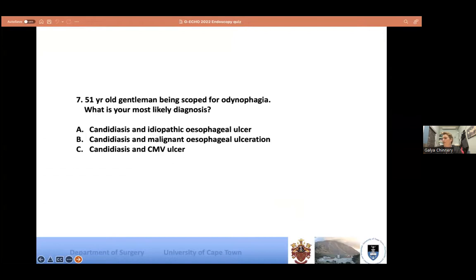I hope you all get this one. That's pretty classic. Okay, let's see, Cheryl. Yes, good. So most of you agree that's very likely to be a CMV ulcer. They almost look stapled out, punched out is perhaps a better word. Very smooth cut out edges, like you've gone and cookie cutted out a piece of the mucosa. And in this one, with some imagination, you could see the circular indentations of the circular layer of esophageal muscle.